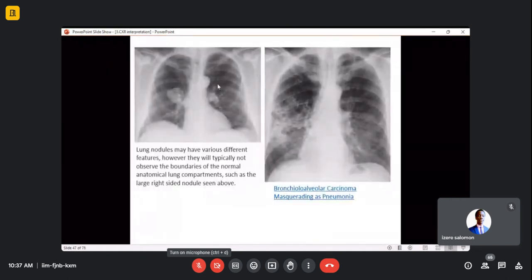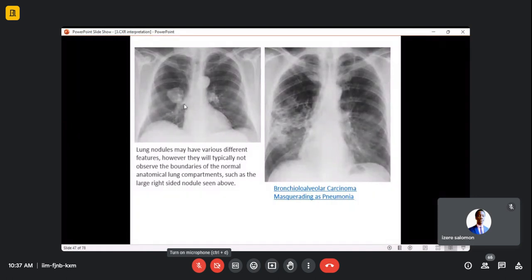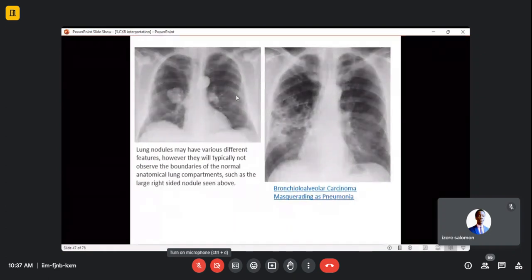This one is a well-defined mass or nodule, parahilar, because this is the hilum, this is parahilar or perihilar, within the hilum. Well-marginated, homogeneous opacity. But we saw another one here, another small nodule, homogeneous, well-marginated. The rest of the lungs are okay. Costophrenic angles are good. The size of the mediastinum is fine. This is the aortic arch. The size of the heart is okay.